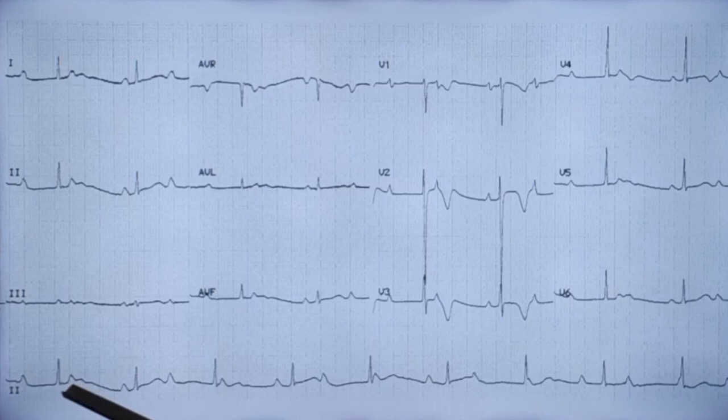Your blocked P wave is superimposed on the T wave here, as in this case, and another P wave here, very long PR interval, a slight prolongation of PR interval, long PR interval, a medium prolongation, very long PR interval, a slight prolongation of PR interval, very long PR interval.